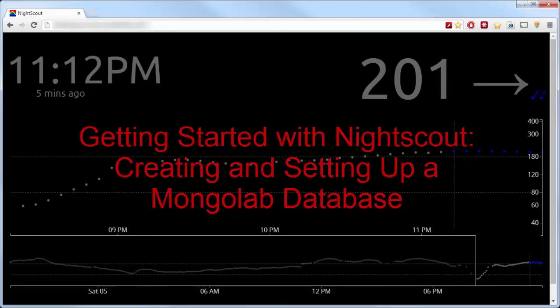In this video, we'll walk through setting up an account on Mongolab, the website used for uploading CGM data. Then we'll create a new database, a user to access that database, and a collection for storing data. Finally, we'll copy out the bits of text needed to make the Android upload device work and to connect the website where your CGM data will be displayed.